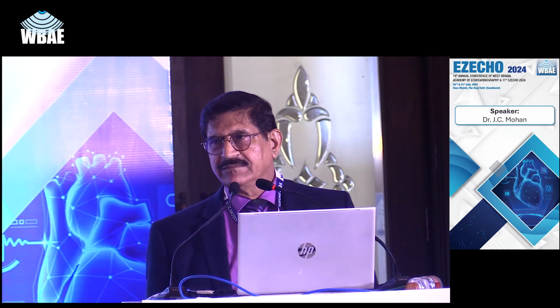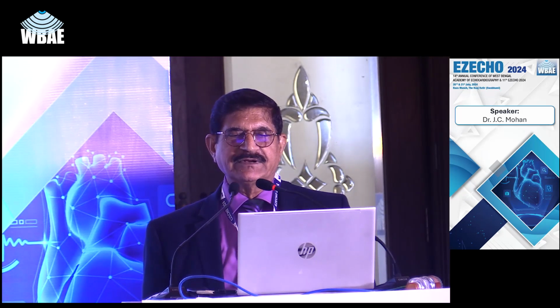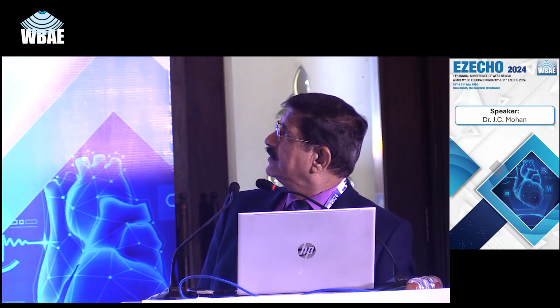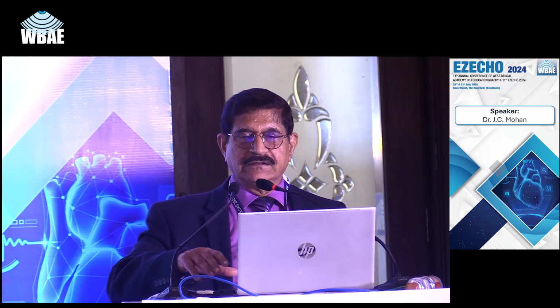Iso-intense myocardium, left ventricle hypertrophy. You also see asymmetric septal hypertrophy. And the last picture of perfusion. Perfusion is normal, but you do have thickening of the walls and of course the left ventricle hypertrophy.